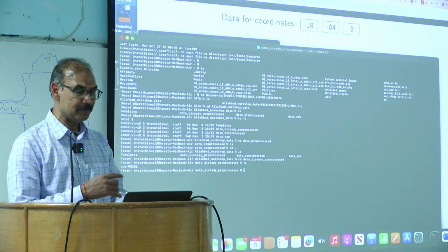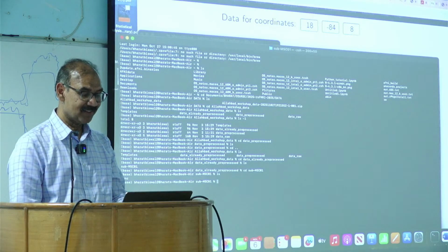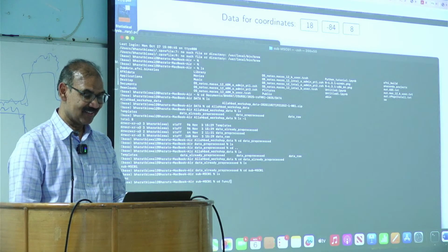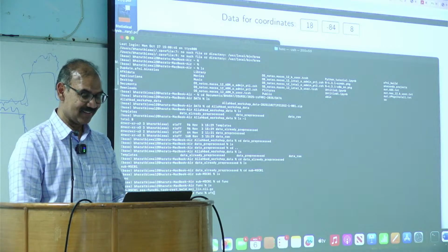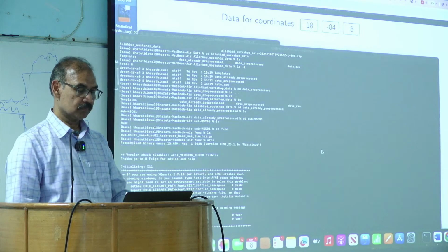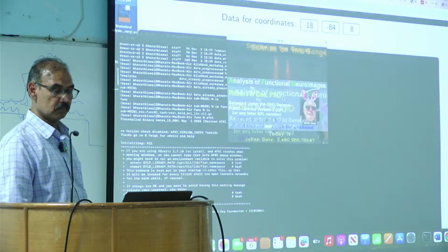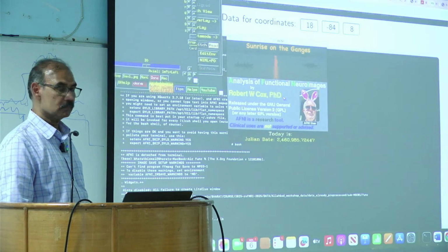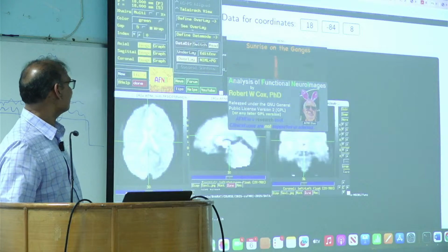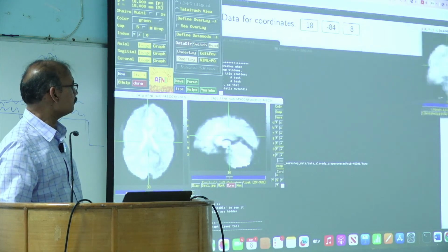I'm just using AFNI, so just give me 1 second. Right, so this is another package.